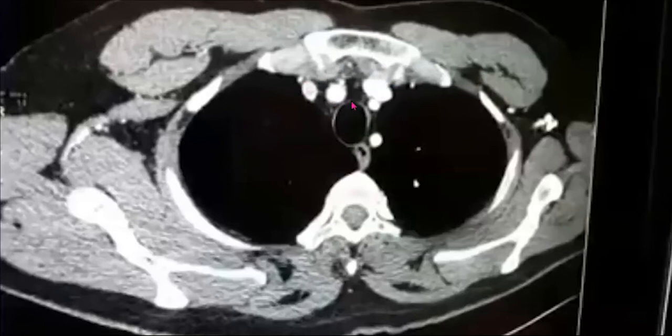These are number 1, 2, 3, the branches of the aorta, and respectively these are the brachiocephalic trunk, left common carotid artery, and left subclavian. Here you will find difficulty in differentiating these. So let us start with the left and right brachiocephalic veins. As we move down, the left brachiocephalic vein will come closer to the right brachiocephalic vein to form the superior vena cava. Let me show you with the diagram.